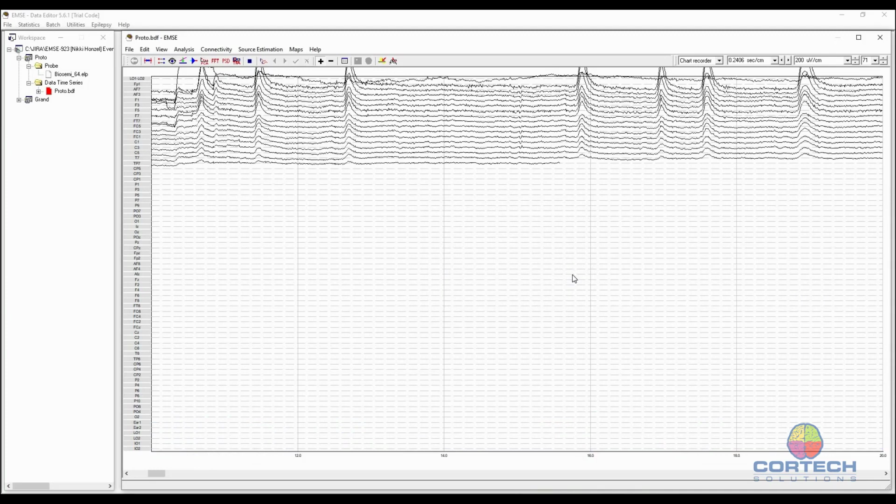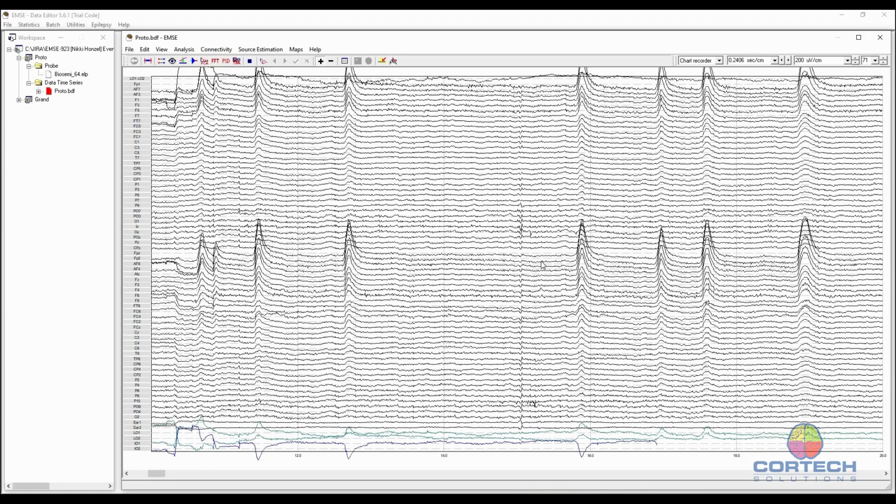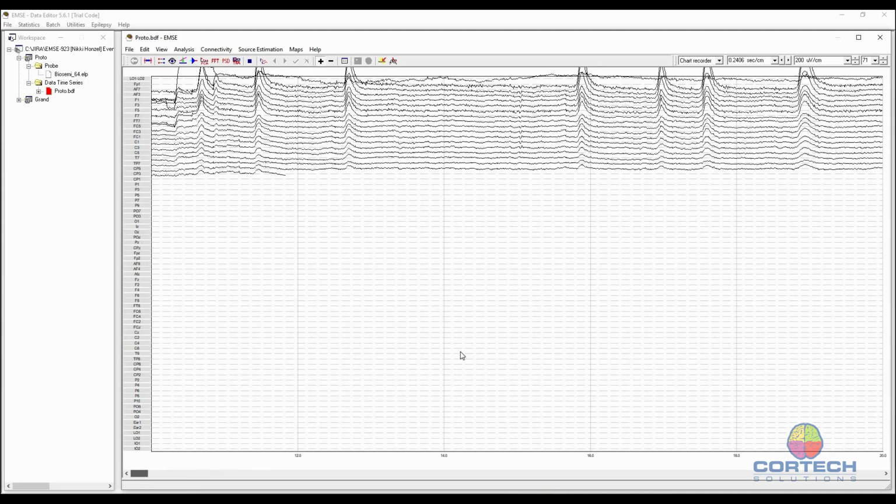Okay. So this is the prototype. If you want to change the filter settings or add other filters or anything in the pipeline, you can change it here in the proto, and then the scripts will use this pipeline, as we'll see in a bit. The other thing about this is you'll notice you can set certain default display preferences.